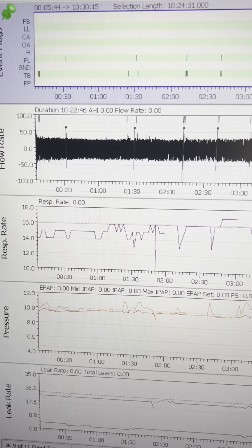It's probably that even that 1 PS change didn't change that much in here. Although you can see that it goes really low sometimes, like it spikes up and down. Here you can see that less. It only goes 2 down right here. Here's still 3 down, so that's not that good. But right here it goes 2 down, more 3, up and down, up and down. It goes a lot under there, especially here at the end. And I don't think I see that anywhere with 6 PS. Yeah, right here it's kind of more nice. Right here there is some big one.